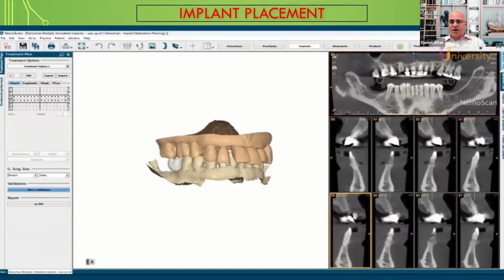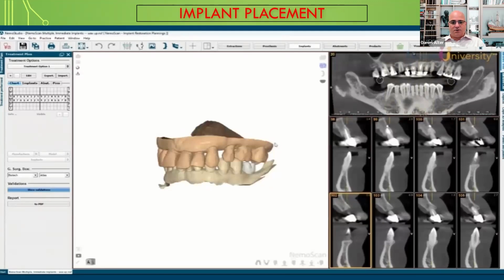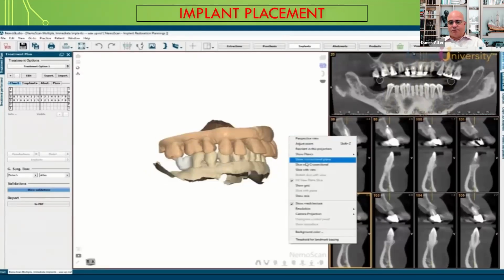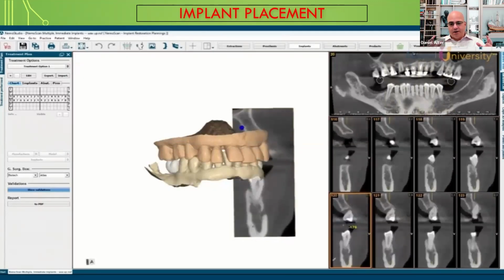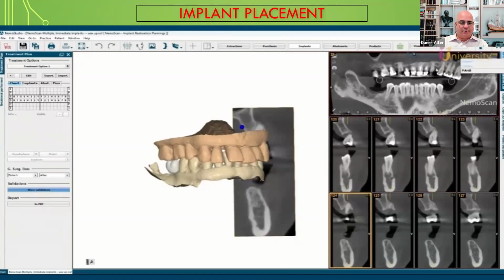I'm going to move these back just to make sure that we can mark the density units so that we have the proper stability, we have the proper viability for these types of restorations. And what you'll see is we can superimpose it in 2D or 3D over a static, as you see here. The nice thing is everything is integrated, everything aligns, and as I move one plane, it allows me to see it in a three-dimensional plane as well, so that all are very comprehensive into the design, or the real thought process, into creating these surgical guides.